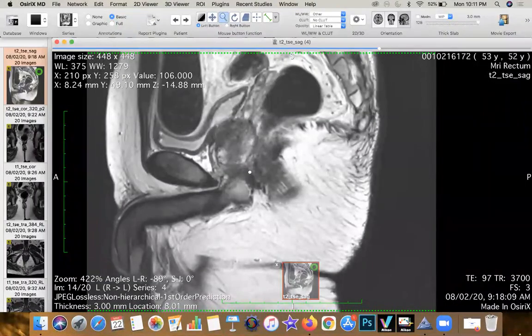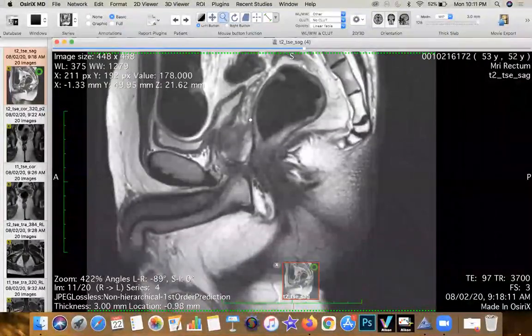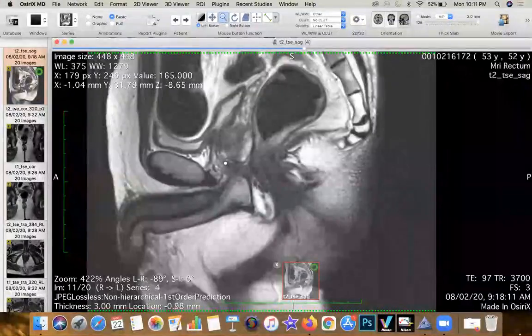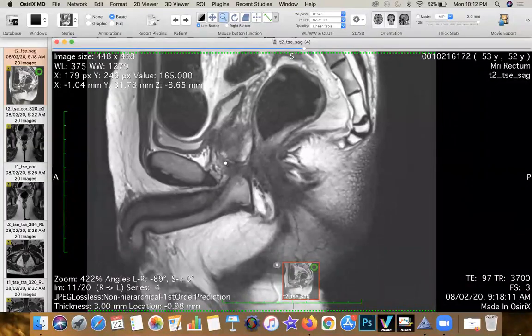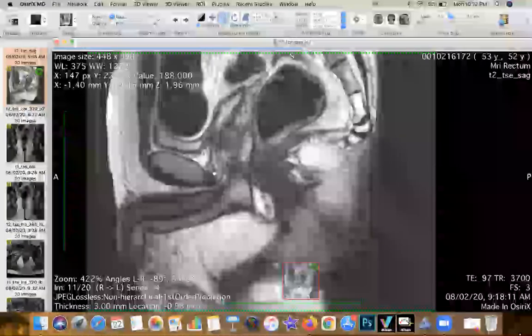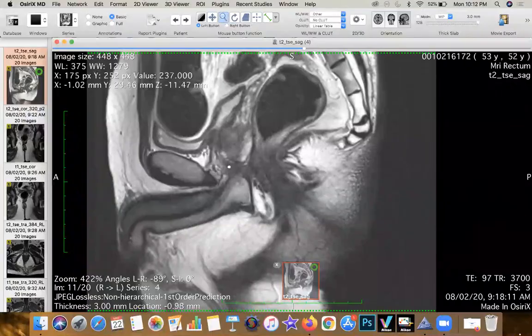Other important structures to always remember is the perineal body. Very important to also identify. In men, you have the rectoprostatic shelf. In women, you have 2 shelves, which is the rectovaginal shelf, and of course, the vesicovaginal shelf. Each of these is very important. The vesicovaginal shelf is reinforced by the pubocervical fascial reflection. A laxity of the pubocervical fascia, or breaks or disruption, is going to cause anterior compartment prolapse, and you tend to get cystoceles.